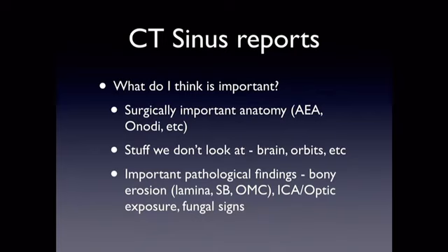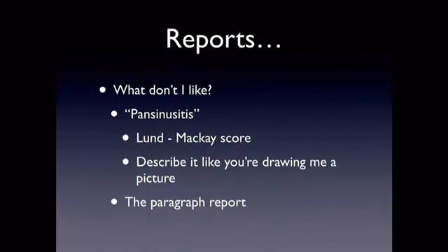We probably look at scans more than most people, even more than probably most ENT surgeons, but they are very important to look at. I don't like the pansinusitis. It gives me no information at all about what's happening with the patient. The Lund-Mackay score is something that was developed over in the UK, and it gives a score for each sinus on each side as to how bad the disease is. I similarly find that completely unusable.